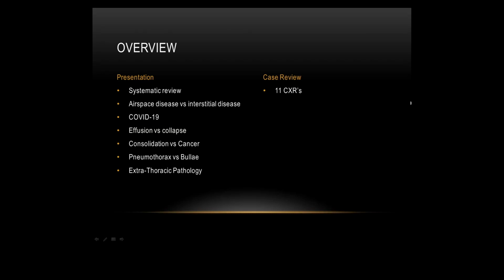Now, I'm sure that on the wards, people have been saying this is how I do it. I do an ABC approach, or I do a DCA report approach. There's all sorts of different ones out there. So what I'll do is show you the way I look at them. You never know, you might pick something up new that somebody else doesn't go through. So you can just come up with your own system.